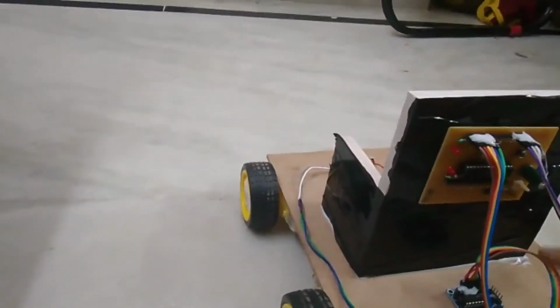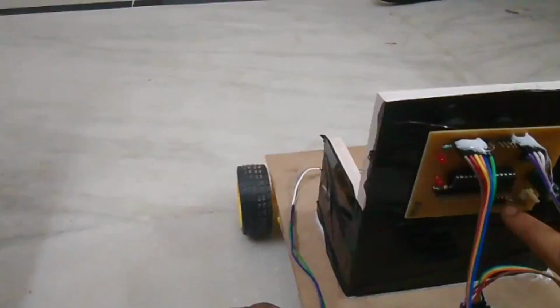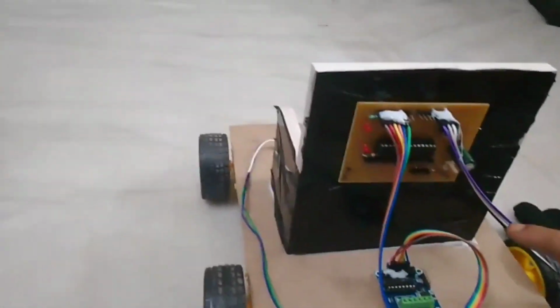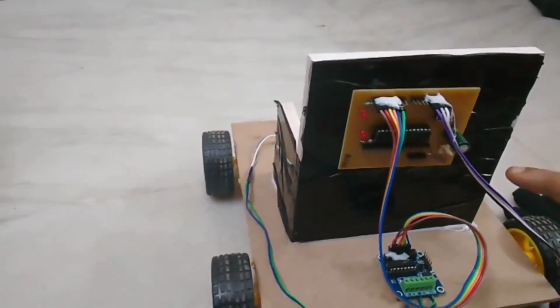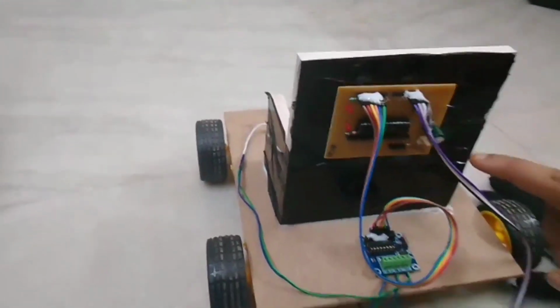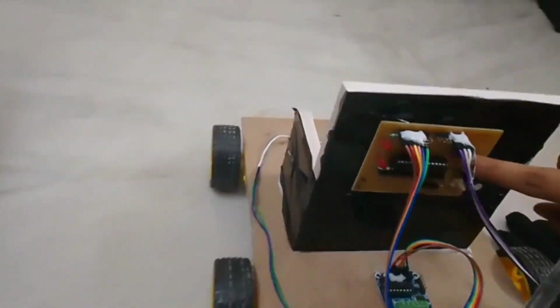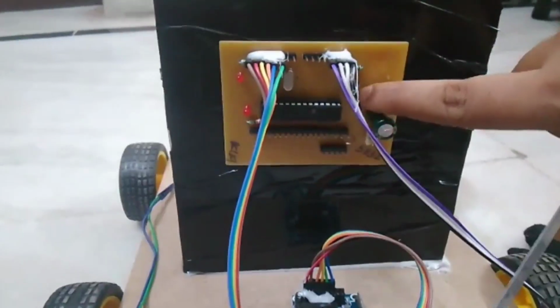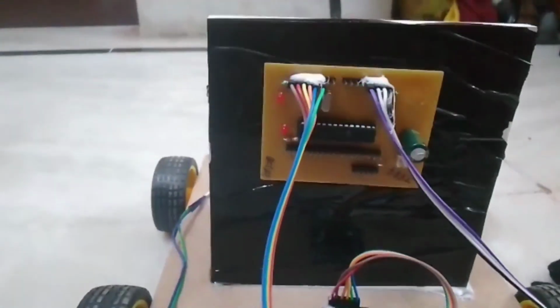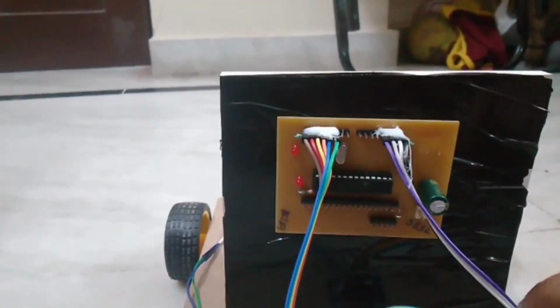This is the analog to digital converter. It is an electronic circuit that measures a real world signal such as temperature, pressure, or acceleration, and converts it to a digital representation of the signal. This is called the reset button. The reset button is responsible for generating resetting signals when the power is on.